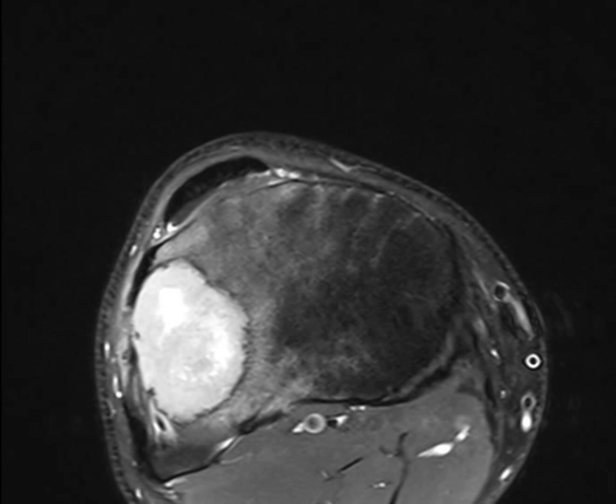The content I would not comment on so much, because on T1 there are no foci of hyperintensity, maybe acute bleeding according to the stage of the blood, but I think it's just a soft tissue mass, no cystic component to comment on. Any giant cell tumor can have an ABC within it, so be careful, because it will bleed if you biopsy it.